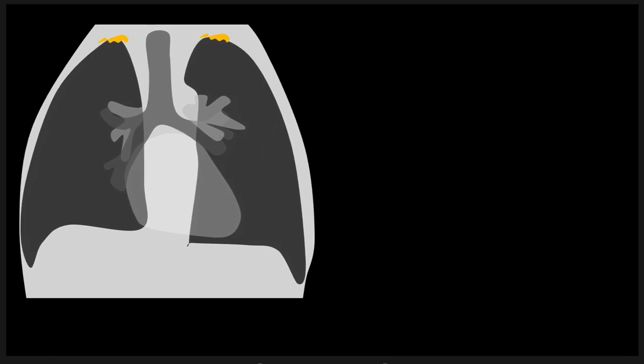You see this in lots of different patient populations, people with emphysema, people with prior infections, the regular kind, and TB, inhalational-related lung disease, silicosis, that kind of stuff. All kinds of different things can cause a little bit of pleural thickening at the lung apices.